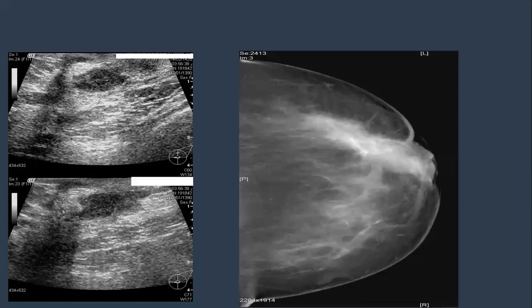Okay. Yes, this is chronic. You said what? Chronic what? Chronic abscess. That is chronic abscesses. Yes, these are chronic abscesses with discharge. And if I remember well, in that case it was... What do you expect it to be?